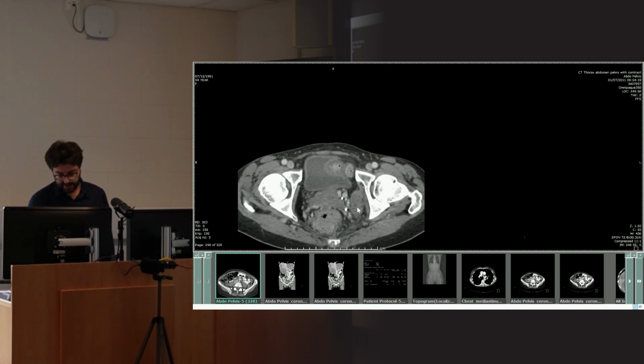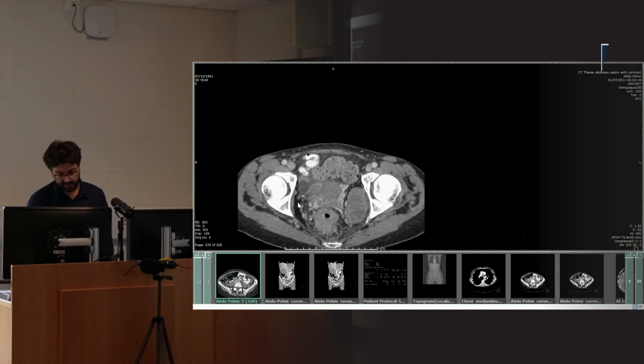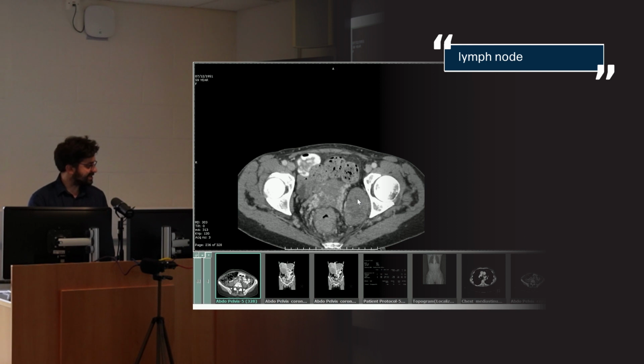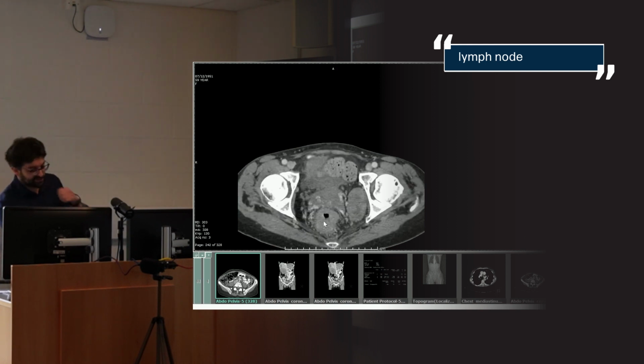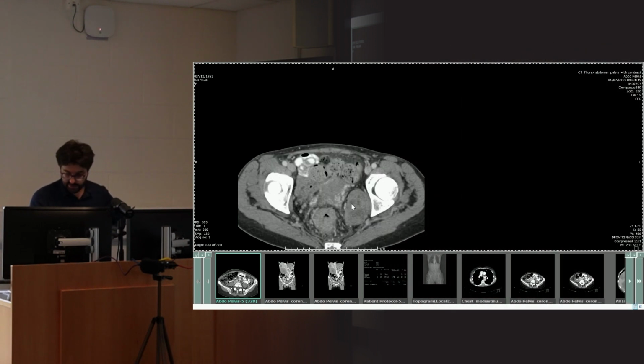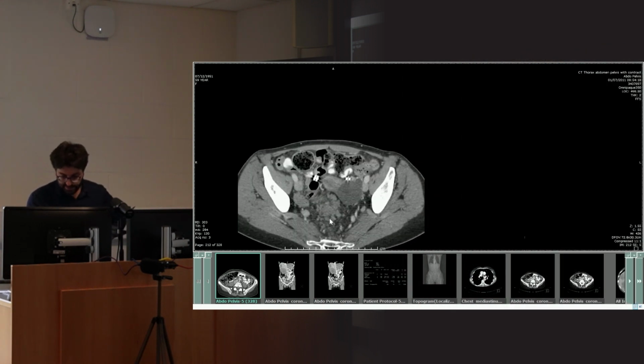It's up against the pelvic sidewall. It's very asymmetrical. You can see on the other pelvic sidewall, you just have fat. What normally lives in this kind of area? Yes, lymph nodes, absolutely. So we've got rectal thickening. We've got an involved pelvic sidewall node. We continue up the rectum.